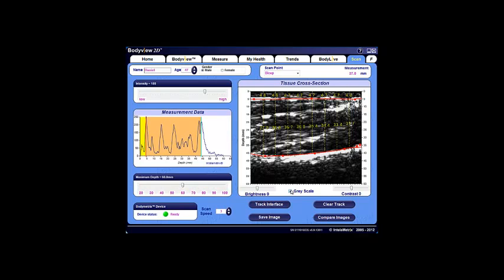Note that there is an option to adjust the scan speed, and the default setting is set here at 3. With speeds 2 and 1, you're dragging the device much slower, which can render a higher resolution scan. However, the default setting speed of 3 should be sufficient.